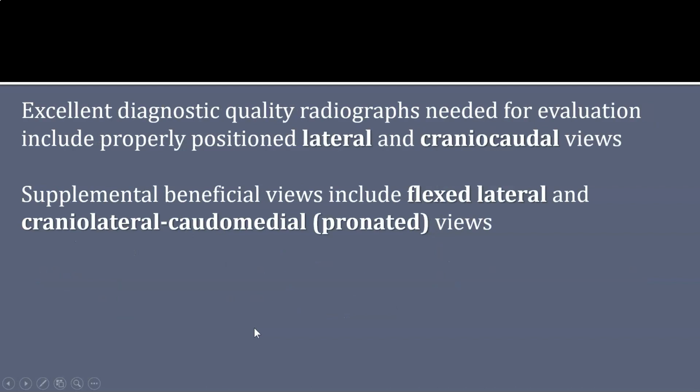Excellent diagnostic quality radiographs are needed for evaluation, and those radiographs should be properly positioned lateral and craniocaudal views. However, there are supplemental beneficial views when evaluating the patient for elbow dysplasia, and in fact, we include all 4 views in our elbow dysplasia radiographic package. Those supplemental beneficial views include a flexed lateral and the craniolateral caudomedial or pronated views. We talked about the pronated view in the presentation on osteochondrosis in the dog.